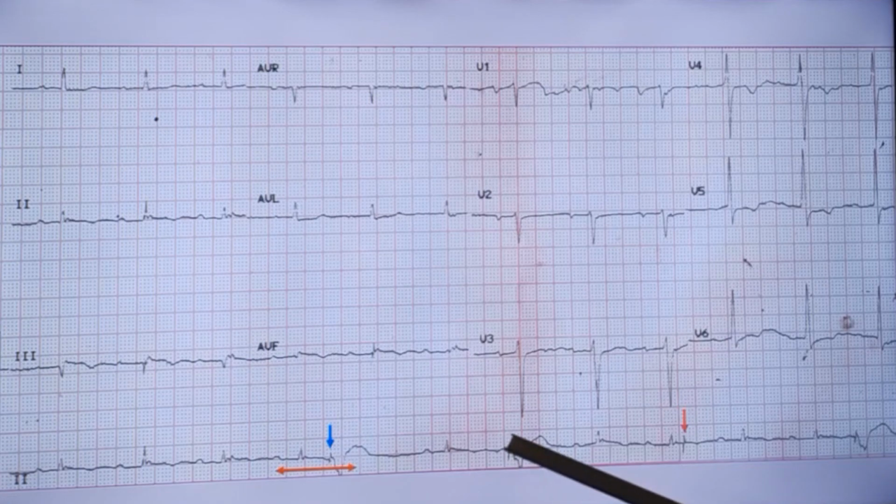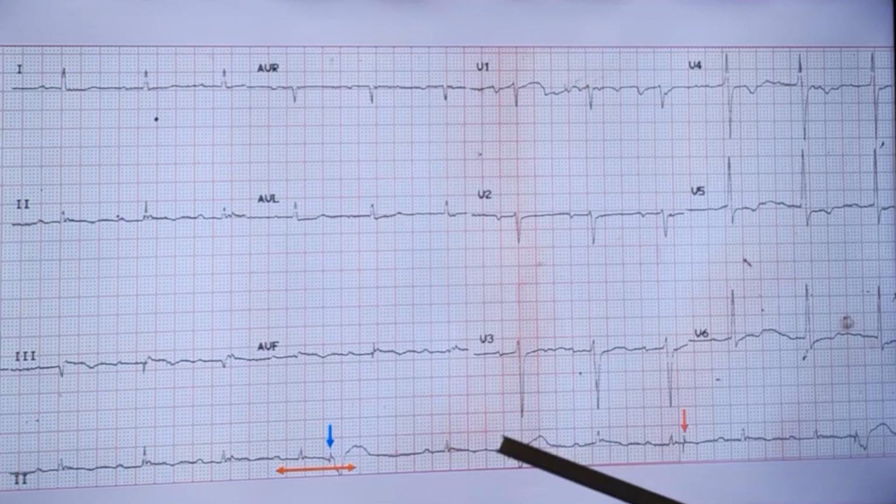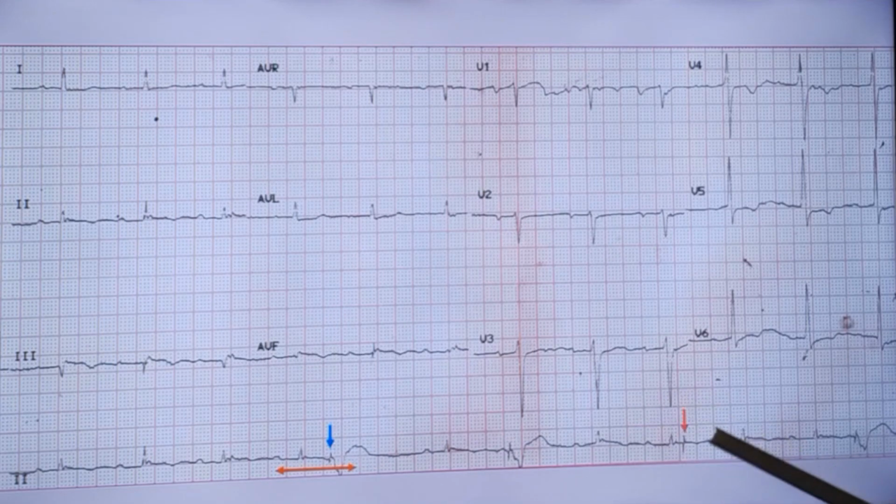This is also a paced QRS complex. This interval is less than the regular sinus interval. So this is also probably indicating a sensing function abnormality. Here it is again one more sensing function abnormality, a very premature pacing spike has come, and here you do not find a QRS complex. Why?